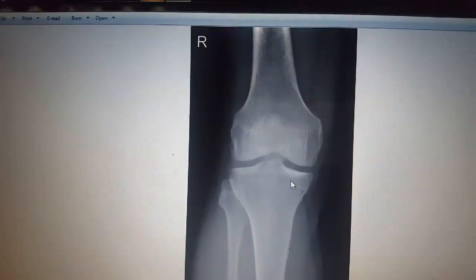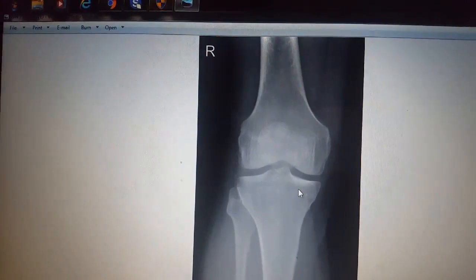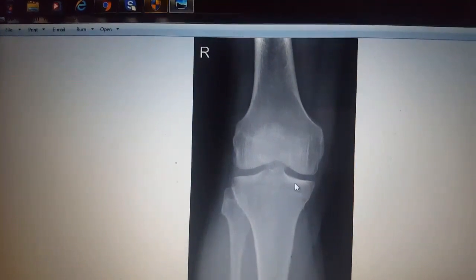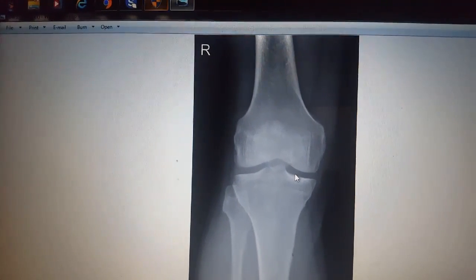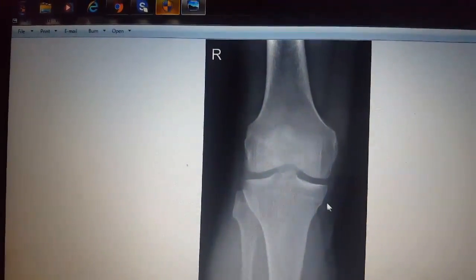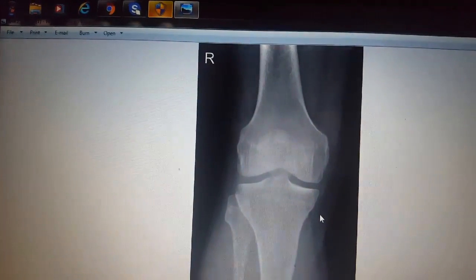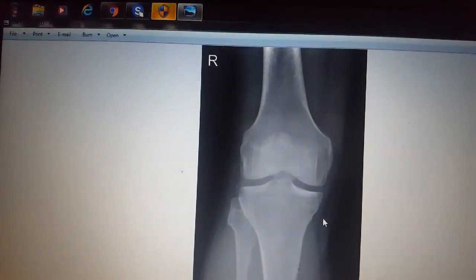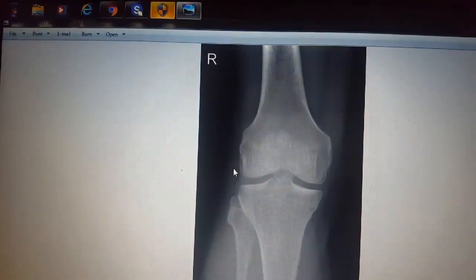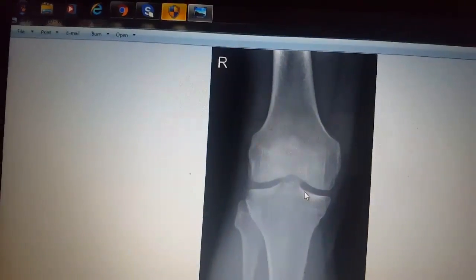And the open femoral tibial joint space with interspaces of equal width on both sides if the knee is normal. So here you could see the open femoral tibial joint there. And also soft tissue and bony trabecular detail. So checking for soft tissue and bony trabecular detail. See our soft tissue on the sides and then our detailed bony trabecular here on the image.